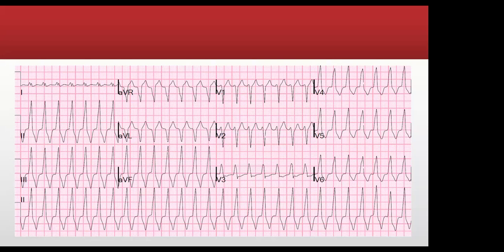And apart from that, what again? Differential? Could just be an SVT, right? So what do you think? Is this SVT with aberrancy or VT? I said SVT with aberrancy. The complexes appear broad.